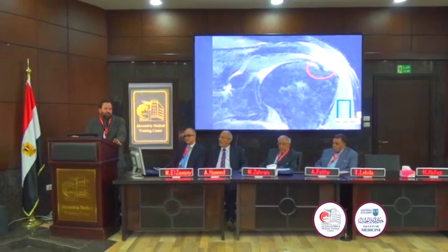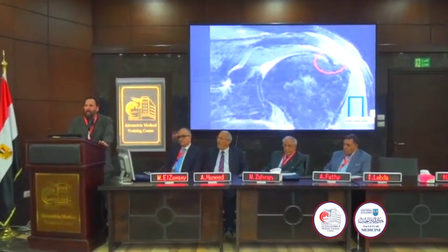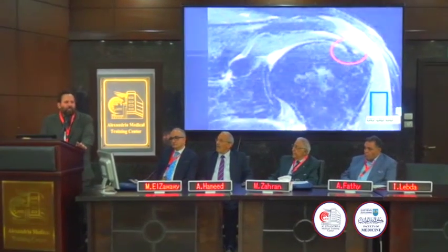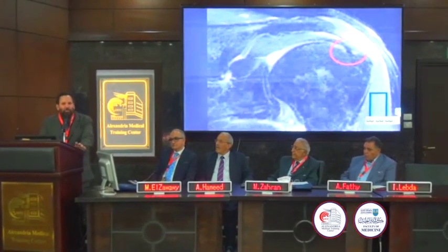So here's an old-fashioned T2 weighted image. And I'm pointing out something I mentioned a few seconds ago. The tendon is black and the muscle is gray. They have almost the exact same amount of water. And the difference is tendons have bound water. The water is bound by glycosaminoglycans. And that's what makes it different.